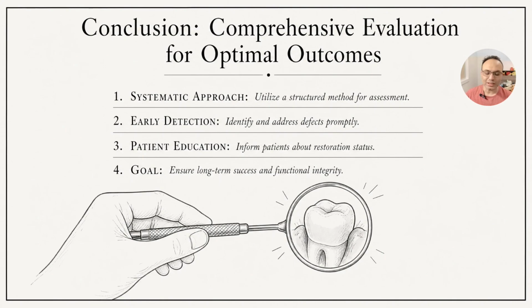Because once you see some of these defects, you know that these restorations are not going to last for long and could be a potential problem in the future.